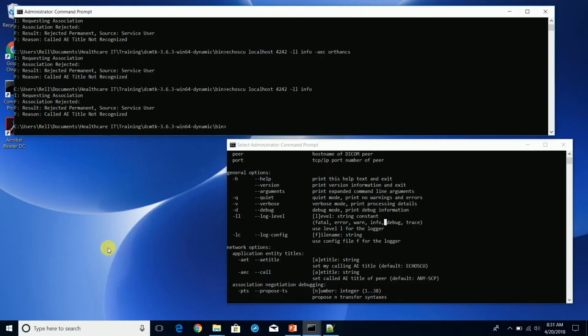So it took a while for us to get all the way around, but we'll see here that because we didn't specify, we used the default AE title as the called. It rejected it because it didn't recognize the AE title.